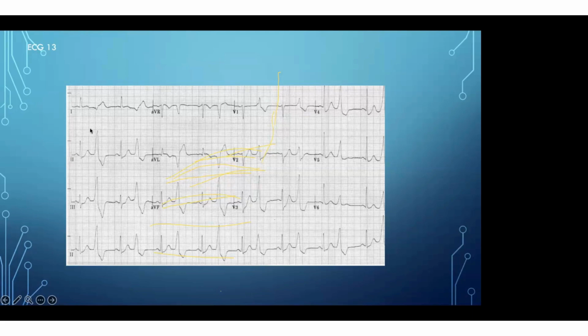And is it a high risk VPC, like fragmented VPCs or multifocal VPCs? VPCs come from different parts of the heart. And if it has a short coupling interval, like R on T, like in ischemia, Purkinje fiber VPCs, with short coupling interval, in those cases it will be a higher risk VPC. So from simply looking at the VPC itself, we can tell whether it is a high risk VPC.